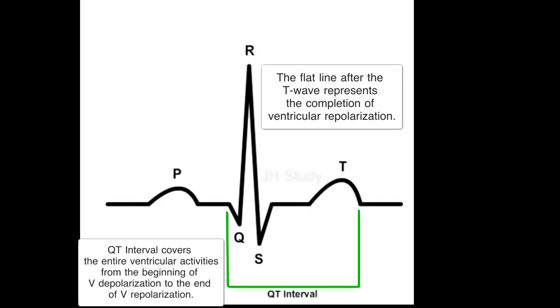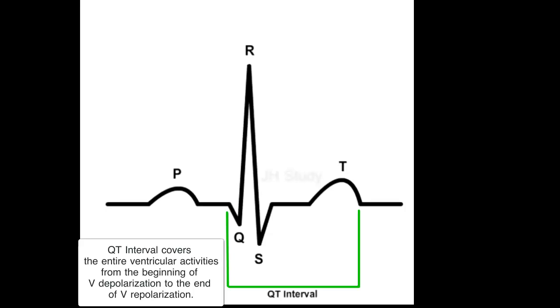The QT interval covers the entire ventricular activity, from the beginning of ventricular depolarization through the plateau phase to the ventricular repolarization completed at the end of the T wave.